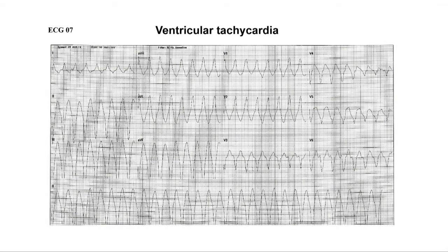Like I was saying before with the other abnormalities, you look at the patient. If the patient is compromised and they have a broad complex tachycardia like this, you cardiovert them, irrespective of whether you really think it's a VT or not. And final thing to say is if somebody's over the age of 60 and they've got a rhythm like this, it's always VT. What about the patients who have little runs of VT and then revert to sinus rhythm?